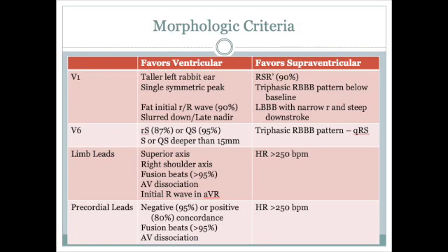What about normal axis? Normal axis isn't on this list. Normal axis can be either. Right axis can be either. So make sure to apply this list correctly. As we work through this, every one of these findings needs to be memorized and recallable to you at 3 in the morning when you're on your 28th call, you're hungry, you don't want to be there, you just got woken up out of a dead sleep, whatever else your problems are. You have to be able to recall this really, really fast, okay?